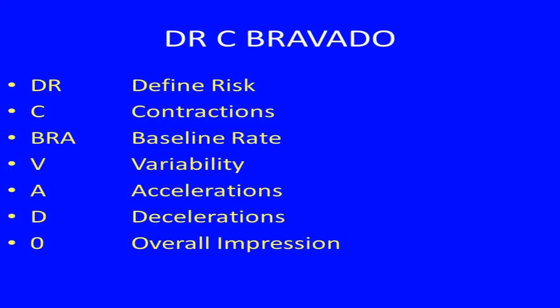DR C BRAVADO is a mnemonic that reminds you of the features of the CTG. DR, define the risk. C, the contractions. BRA, baseline rate. V, variability. A, accelerations. D, decelerations. O, overall impression of the CTG. DR, define the risk: tell why you are doing the CTG.